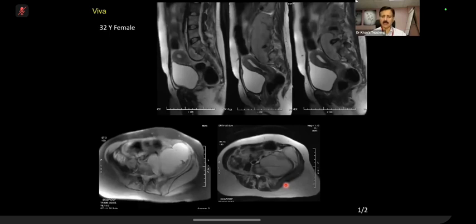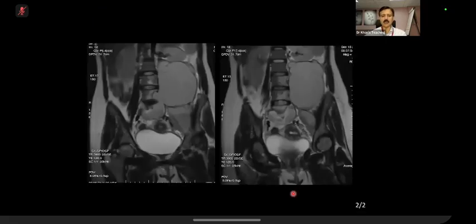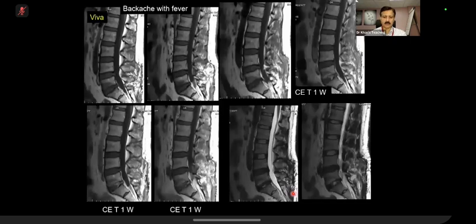I don't have time. But having said that, remember, they will show it to you on an axial slice, and that is why I'm showing you this. They will begin with an axial slice. Even on a T2, if you see replacement, you will be looking into the spinal canal, and that will give you an indication that something is wrong. So they might start with an axial, and this is the point I wanted you to highlight. This is a psoas sepsis, and psoas sepsis is very common with TB.